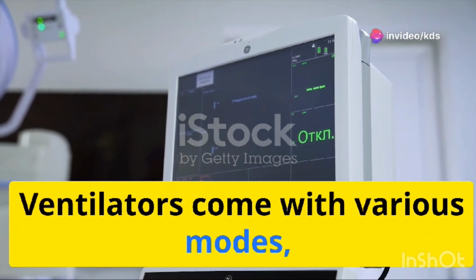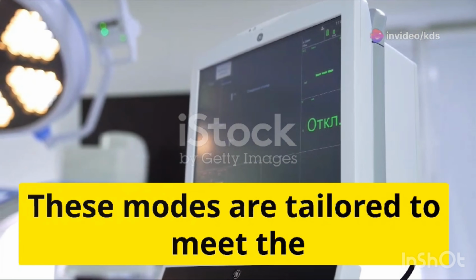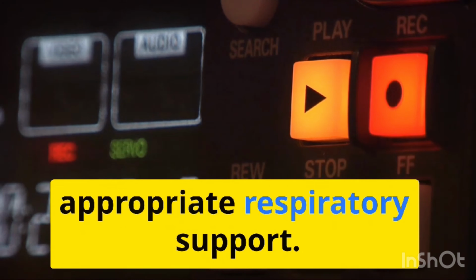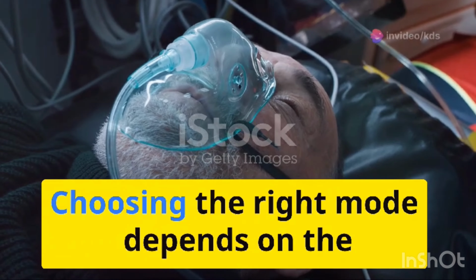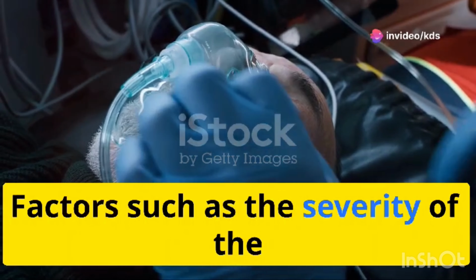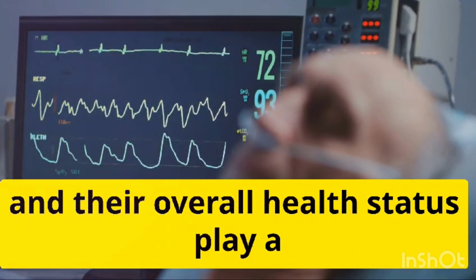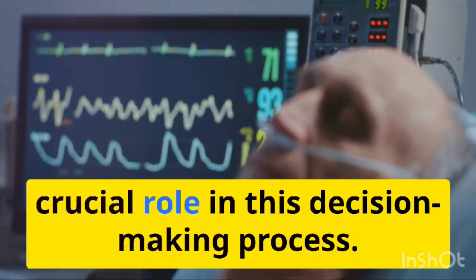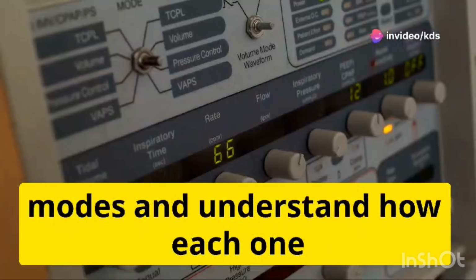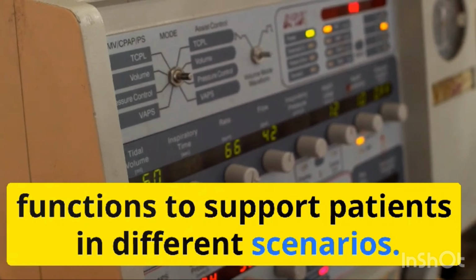Ventilators come with various modes, each designed to support breathing in different ways. These modes are tailored to meet the specific needs of patients, ensuring that they receive the most appropriate respiratory support. Choosing the right mode depends on the patient's condition and needs. Factors such as the severity of the respiratory issue, the patient's ability to breathe independently, and their overall health status play a crucial role in this decision-making process. Let's look at some common ventilator modes and understand how each one functions to support patients in different scenarios.